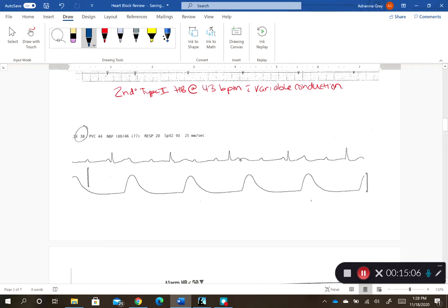All right, this one we don't really have any small boxes because of copy, but it does give us a heart rate of 38. Go ahead and circle all of our P waves. There's a notch there, there's a notch in there. And let's go through and see if we can label this one. So starting again at the beginning at first degree. Could it be a first degree? No, I've got some PR intervals like this one, this first one, where it's pretty close.